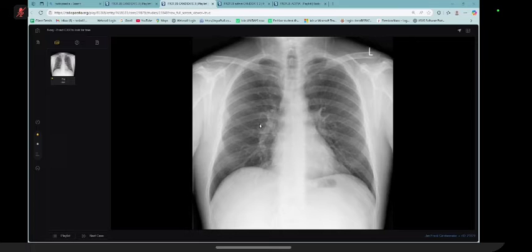For this, I will look at the soft tissue also. In the chest, I couldn't see abnormality within the soft tissue. So I really couldn't appreciate marked abnormality. Maybe there is something here in the left lung, but I'm not sure about it really.